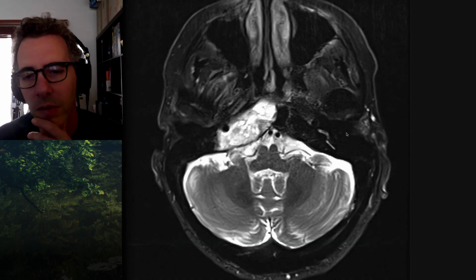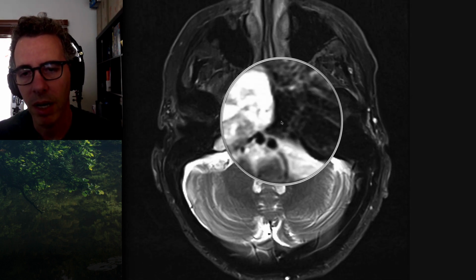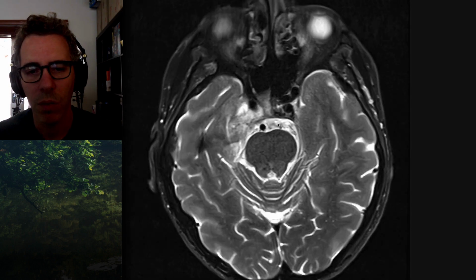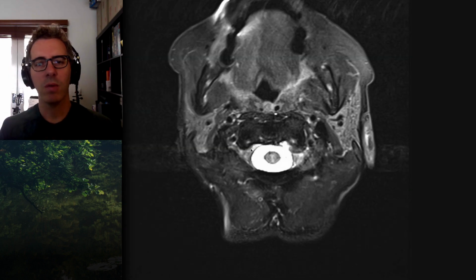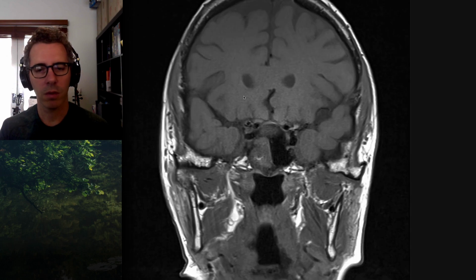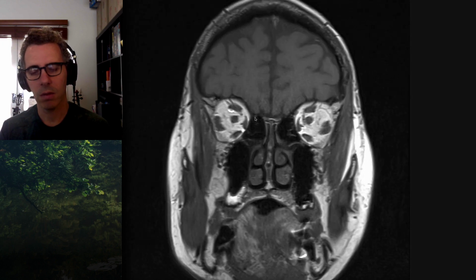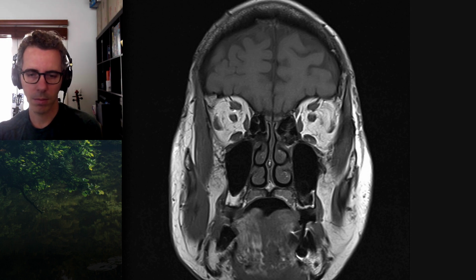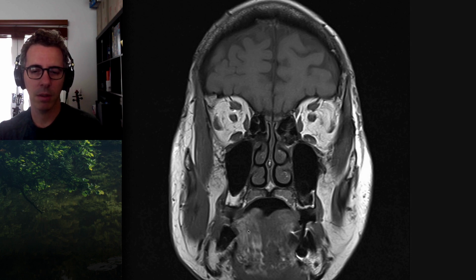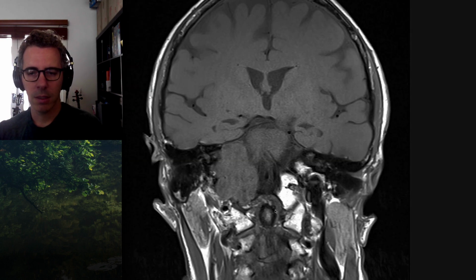Okay, so if we have a look here, MR's hard, right? But if you look at the midline of the clivus, it looks pretty well defined. It's not too horribly aggressive. There's one more clue. I'll show you the coronal T1 maybe. Scroll anteriorly where you can see the tongue. What do you see with the tongue? Oh, in terms of the atrophy. So there's fatty atrophy, right? And so the hypoglossal nerve is involved, so kind of a cystic schwannoma. That's what this is. Ah, cool.